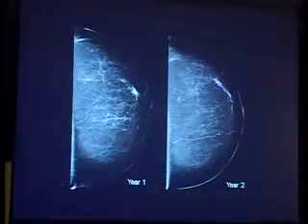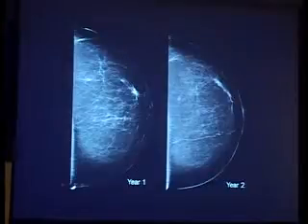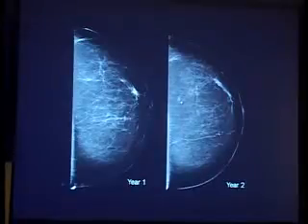Yes, warm and hot. Okay? So here it is now. Something that wasn't there before stands out, new. Could be summation, could be the way, but because I'm presenting it as a teaching case, telling you there's a cancer, we're going to be focusing on that area.